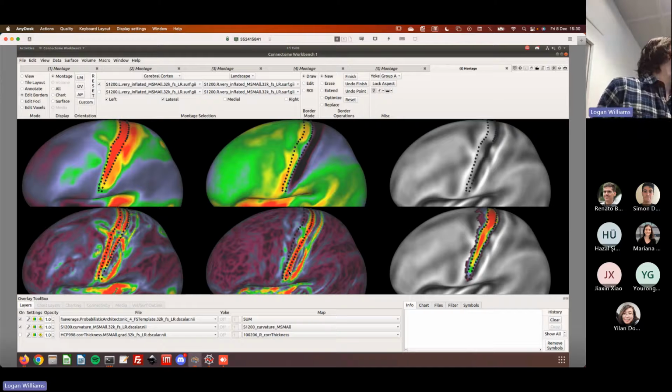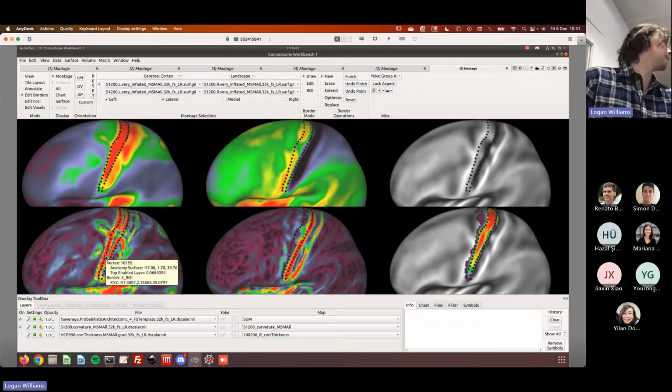Yeah, kind of. What about the dots that are in the dark space? Still on the gradient. Those are defined by the borders. It doesn't have to be exactly the same, there doesn't have to be gradients. I mean, the anterior boundary would have been probably delineated with myelin plus some fMRI features that I'm not showing.